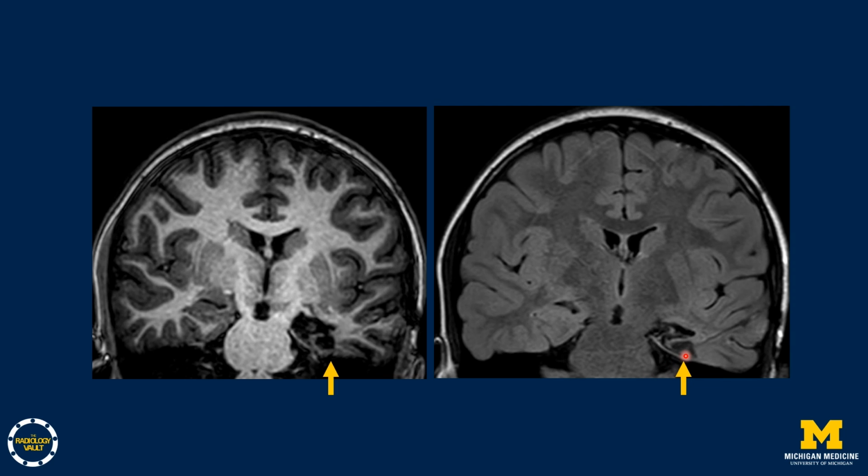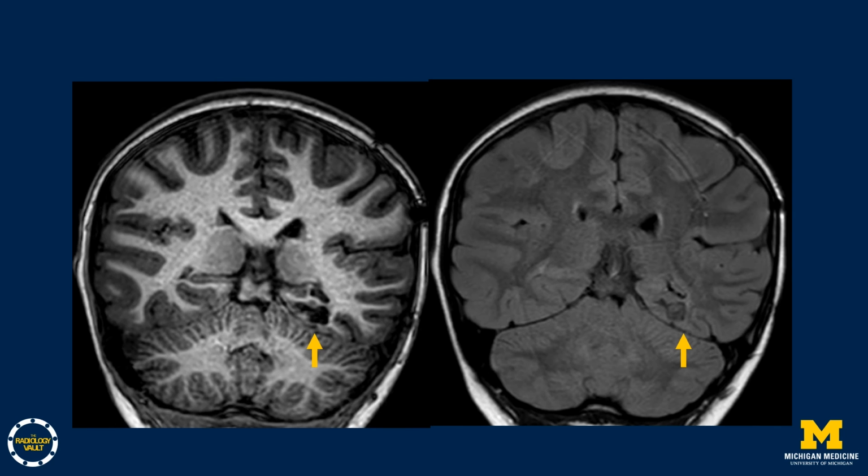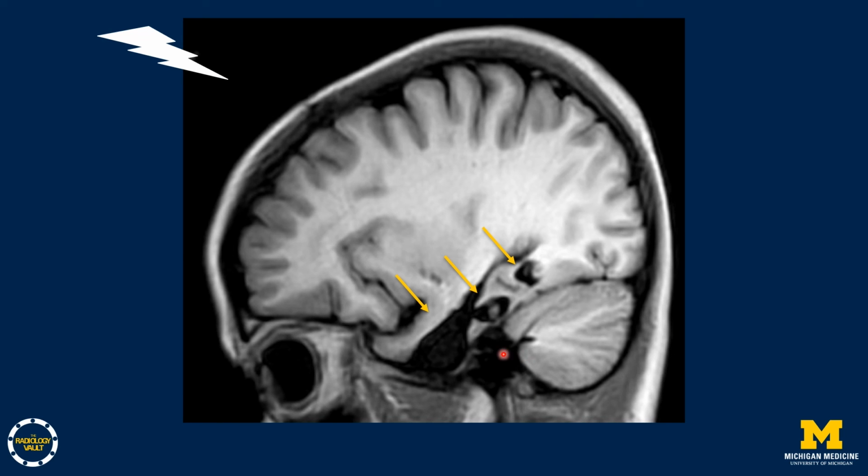Slightly posterior to that, you see a residual area of blurring and hyperintense signal, but even further back, here's the site of the second ablation, shown here and here. So on the sagittal views, you can see what was done. First is the initial temporal lobectomy defect, the site of the first ablation, the site of the second ablation. There is this region that remains present but is essentially disconnected from the rest of the brain, as this patient has remained seizure-free. In conclusion, epilepsy imaging tells a story.